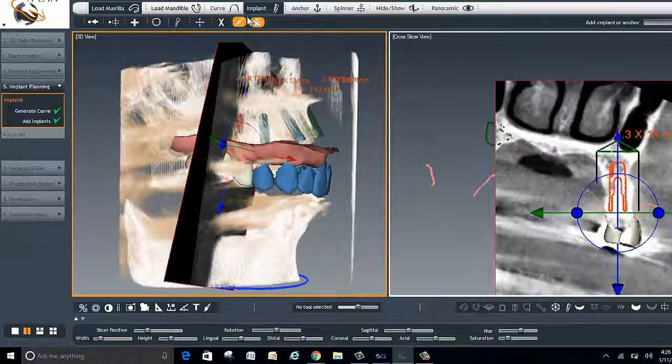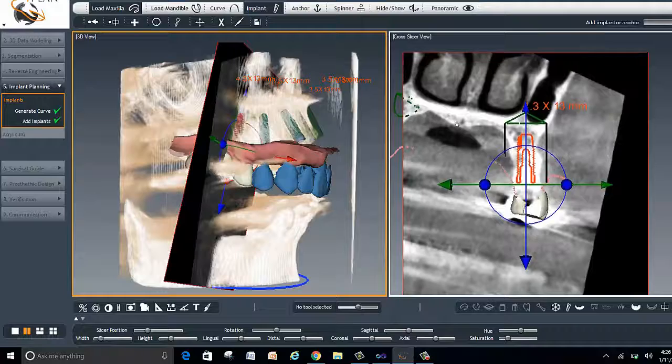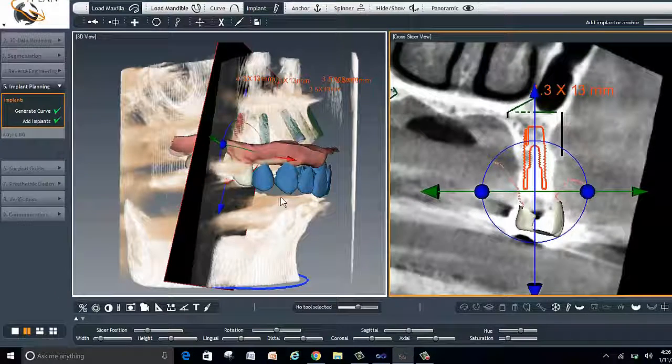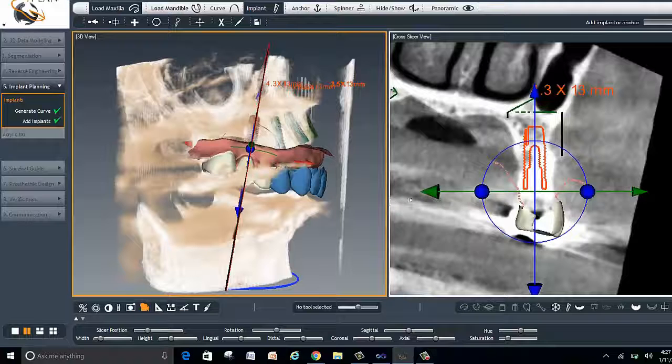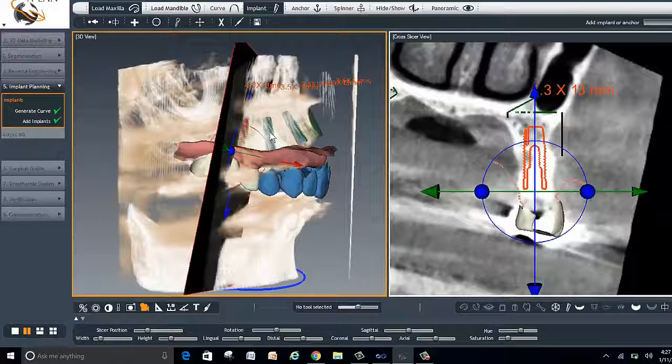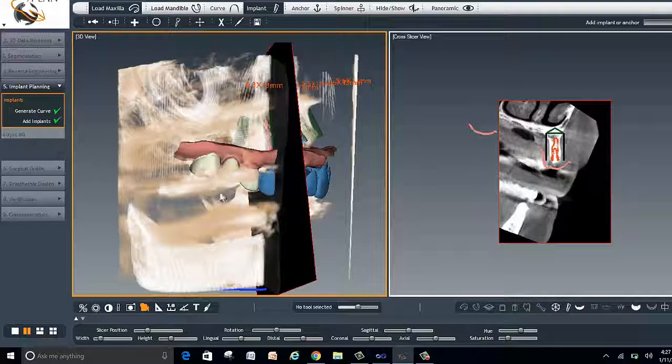We're going to angle the implant so we don't have to do any sinus grafting. It'll be a graftless technique, and this implant will be a 4.3 by 13 millimeter. So it'll be an immediate extraction, immediate placement during the surgery here. And this implant will be away from the sinus, and it should have enough, one third of the implant in native bone, as you can see there, to anchor it.